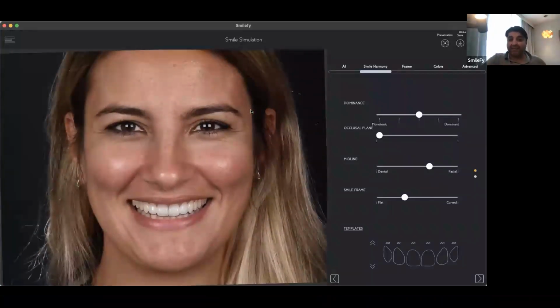The smile can be edgy, can be very specific and young.